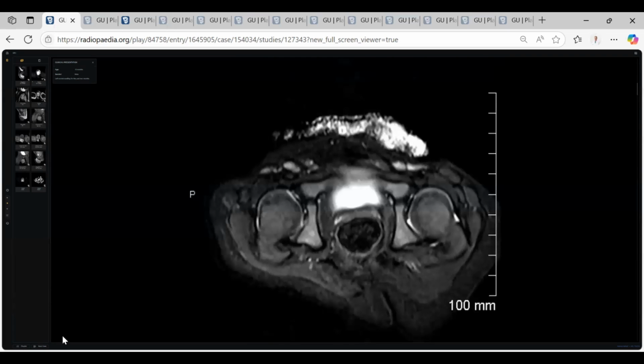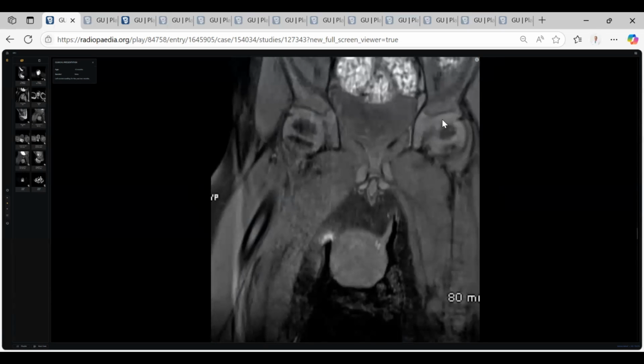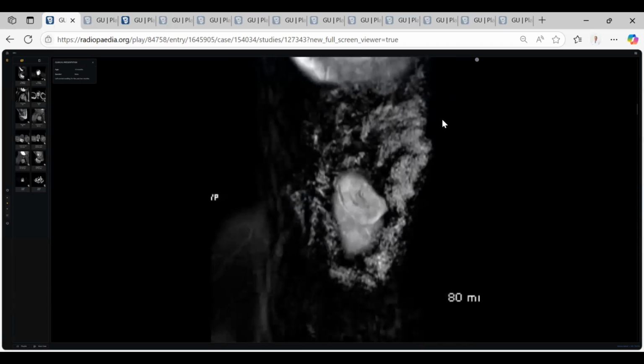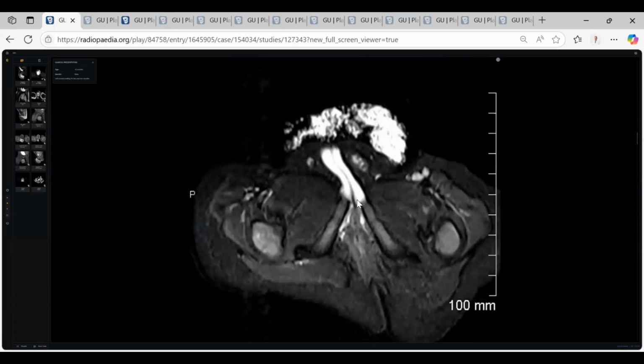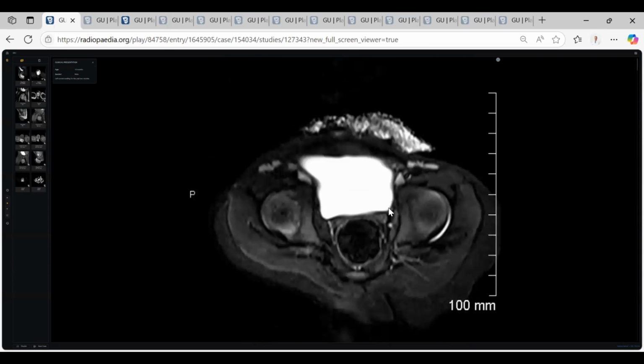See also here, we must rule out any lymph node. Especially here, I think there are multiple, at least left inguinal lymph nodes. This is very important. And para-aortic lymph nodes. But this is a low pelvic examination and the aorta is not visible. But at least we picked up left inguinal lymph nodes, and this will change the staging of the tumor.